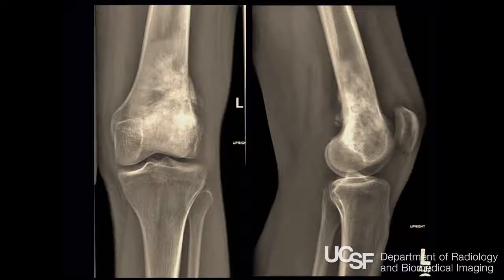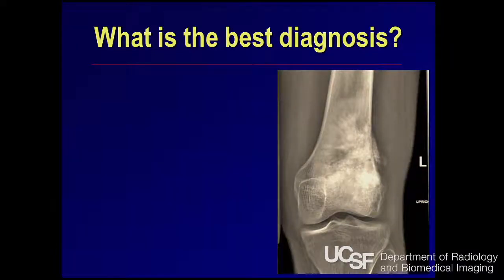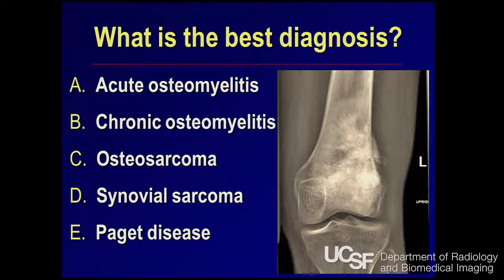What about this case? What is the best diagnosis? The best diagnosis is osteosarcoma.